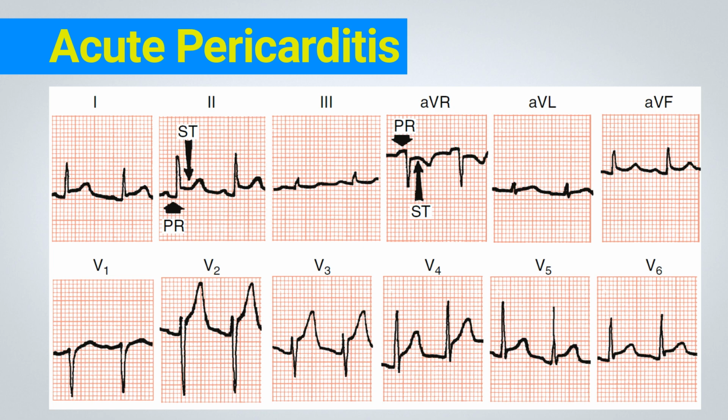An illustration of this can be seen in this ECG, where the elevations occur in leads D1, D2, aVL, aVF, and V2 to V6.